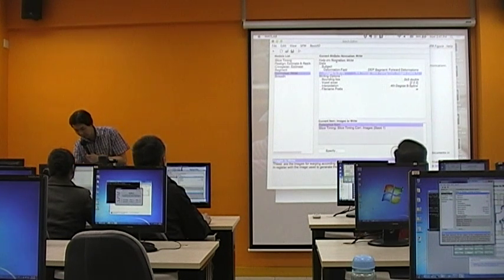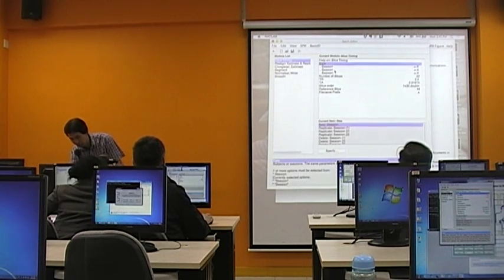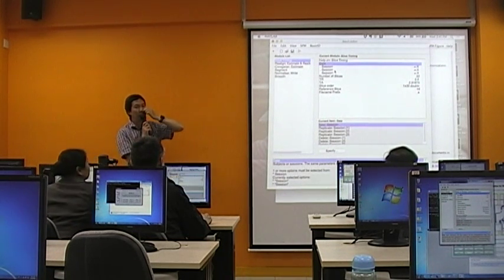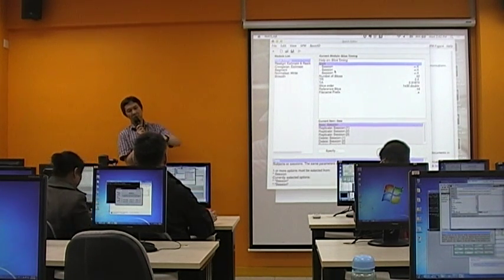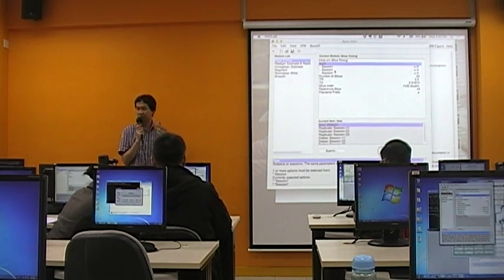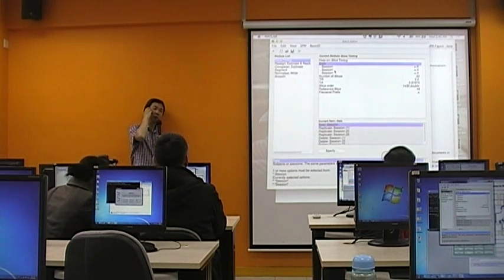So by building up this kind of pipeline, after you fill in the necessary information, for example, in slice timing correction, then you need to fill in session 1, 2, and 3. Then the whole chain of preprocessing will be started. And then automatically the output of one step will be fed in as the input of the next step. Okay? And yes, by doing so you could save some time. You don't need to click for each subject, for each step every time and fill it in.